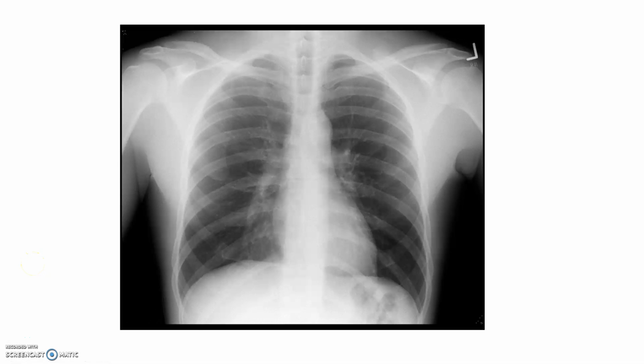Good morning. My name is Israel Fonseca, and this assignment is to identify the anatomy of a chest X-ray.